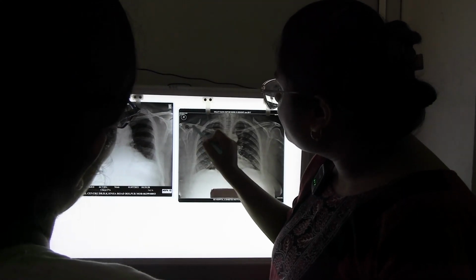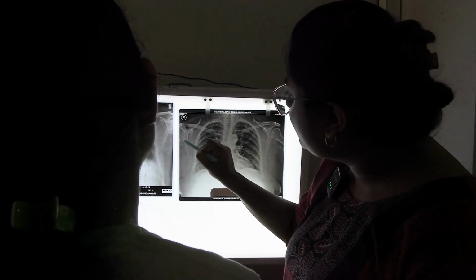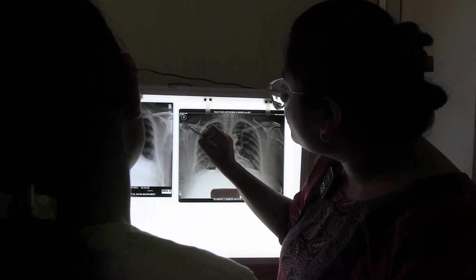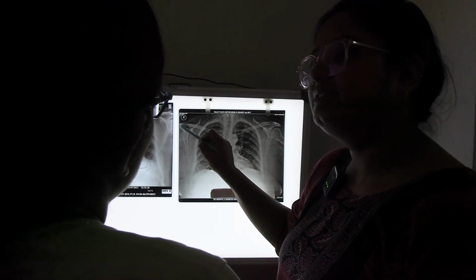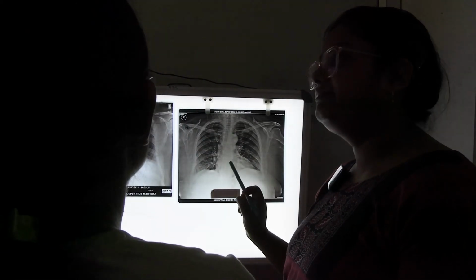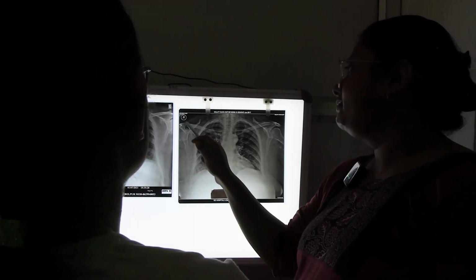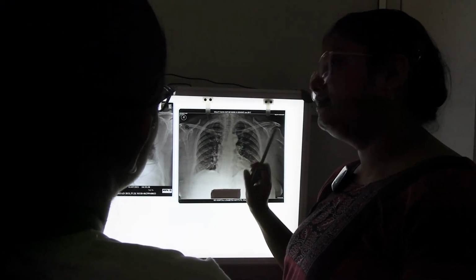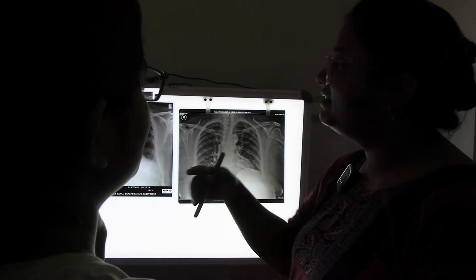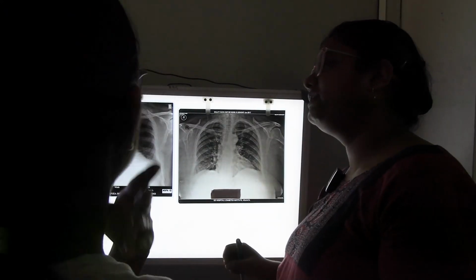This is the superior border mainly. Here is the medial border, lateral border, inferior angle. And this is the spine. Here it is continuing as the acromion process, where it is joining with the lateral end of the clavicle. The types of joints are very important: the acromioclavicular joint, the sternoclavicular joint. Other joints will be seen in the foot also. Different joints, the types of joints, are important.